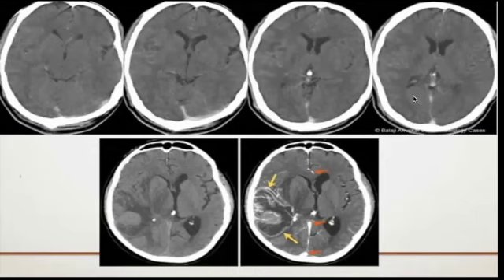However, if this patient is not taking any contrast, I would have said that the whiteness on the periphery is hemorrhage, and I would have said that this is a calcification. So because this image is not stating whether this is with contrast or not, I'm not really able to tell you exactly what I am looking at, okay? So if this appears in your exam, ask whether this has contrast or not. As I said, if it doesn't have contrast, then you would say that these are hemorrhages at the periphery, and you would say that this is a calcification. If it has contrast, then this is just normal.